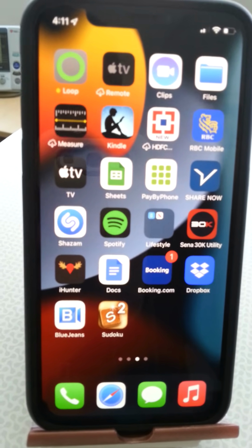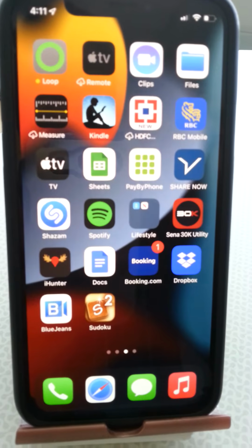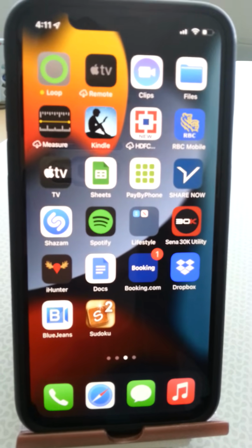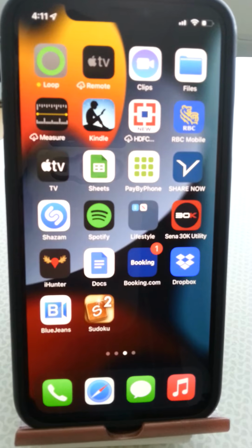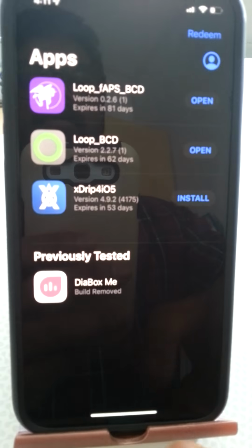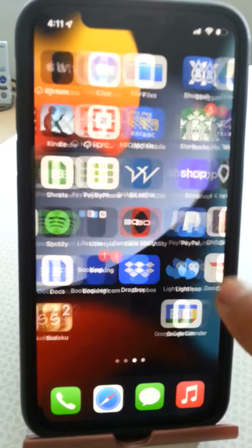This is a quick installation guide to Loop. Loop is the most basic HCL system available to iPhone users. You'll need an iPhone 7 or newer, Omnipod Eros pump, Orange Link, Dexcom, and Rapid Insulin. You must have TestFlight on your phone to run and install Loop. Make sure you turn on Apple Health.